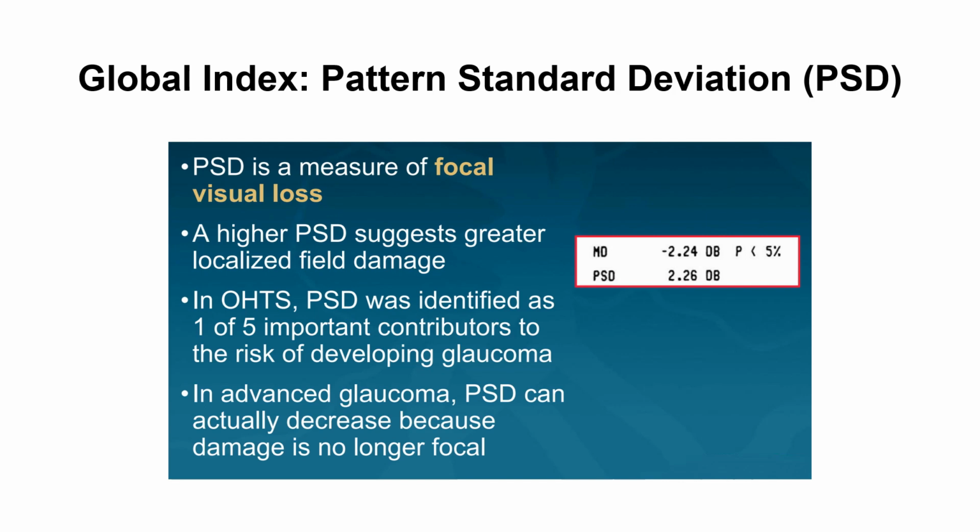Here, a higher pattern standard deviation means higher variability, higher irregularity in the field, which means there is localized field damage. And in the Ocular Hypertension Treatment Study, the PSD, the pattern standard deviation, was identified as one of the 5 important contributors to the risk of developing glaucoma.